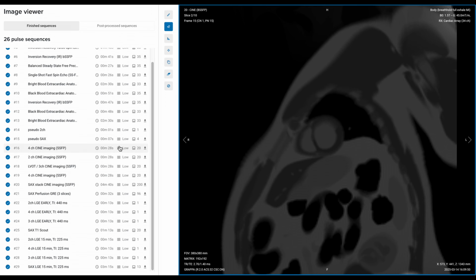Finally, when you perform a cardiac MRI, remember that breathing artifacts are very common, mainly due to the effort required by the patient. Cardiac exams often need 20, 25, or even 30 repeated breath holds in a row, which makes the process tiring and hard to maintain perfectly. Besides instructing the patient to hold their breath, we can also avoid breathing artifacts by using respiratory gating, which is similar to ECG gating, but for timing to the breathing phase instead of the cardiac phase.